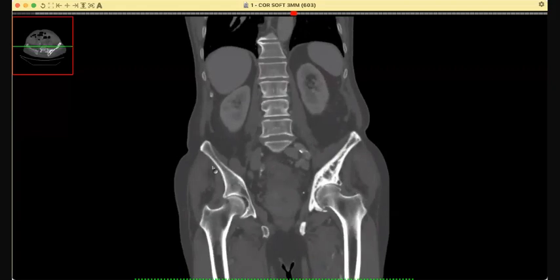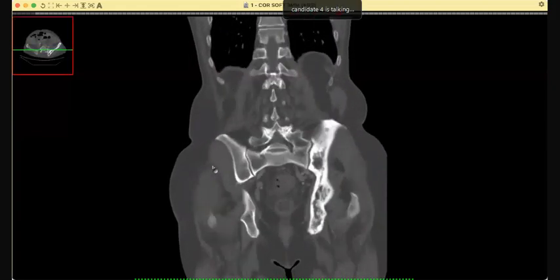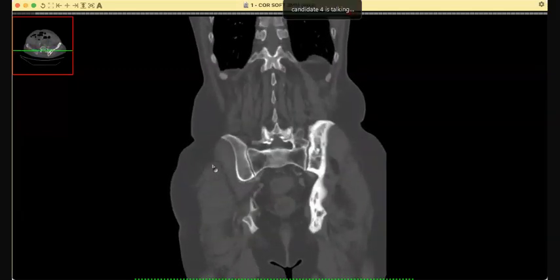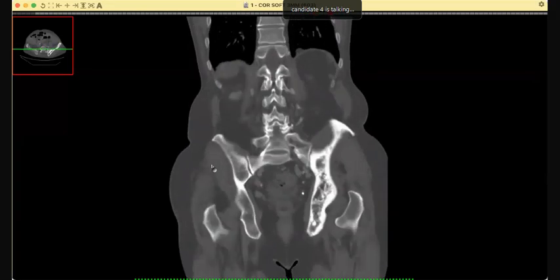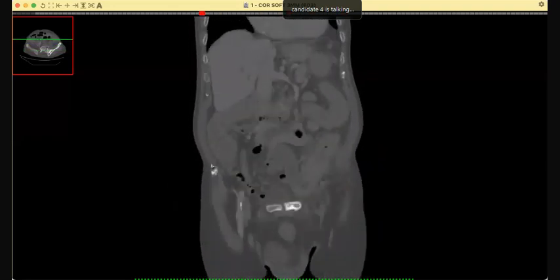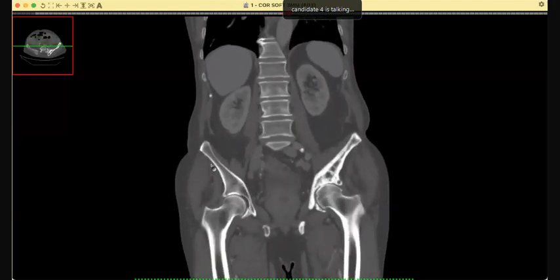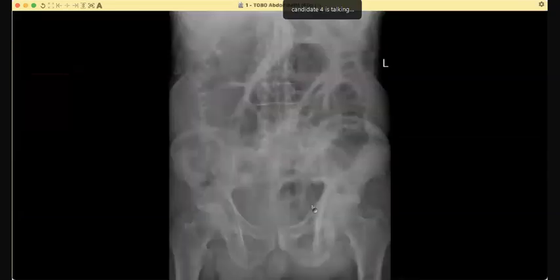There is also significant sclerosis involving the iliac bone. So, conclusion: ulcerative colitis with a pantaloons hernia involving both inguinal regions, and maybe secondary sclerotic metastasis complicating it, or it could be Paget's disease of the left iliac bone. Thank you.